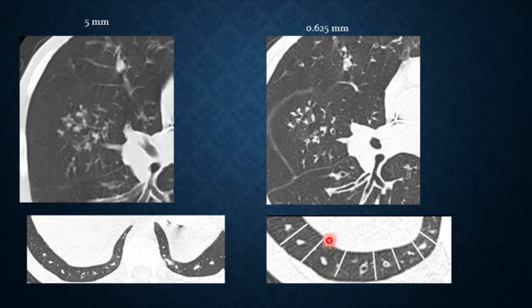You can see it, for example, here, and if you focus really carefully and you see these lobules, you just divide them in your mind into different lobules. At the center of each one you'll see a small ill-defined nodule, sometimes well defined, but usually ill-defined, that represents the alveolar airspace filled with a material of some kind. So this indicates an airspace process.